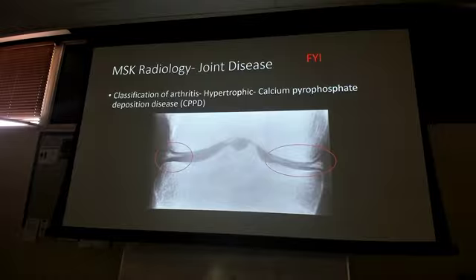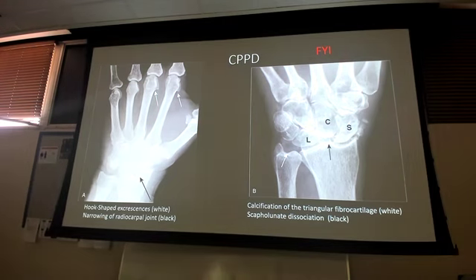Could be confused with gout sometimes, but sometimes it's called pseudo-gout, fake gout. So here's your calcium deposit there. Something you will see again in ortho. It can also be in the wrist, hard to kind of make out there, but really, what you're looking at is the calcium deposits on this one between the lunate and the capitate, the scaphoid, sitting in here. Extra calcium deposits. And then sometimes you'll see these hook-shaped crescents around the heads of the metacarpals.